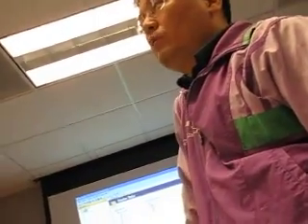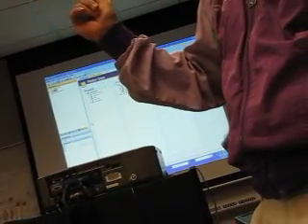If it's an official version, it runs really quickly. But if it is a trial version, it has an intentional time delay in every function. So overall, when you read the sys3d file, it takes a lot of time. I compiled everything with the official one, but for some reason, on other computers, it goes really slow.